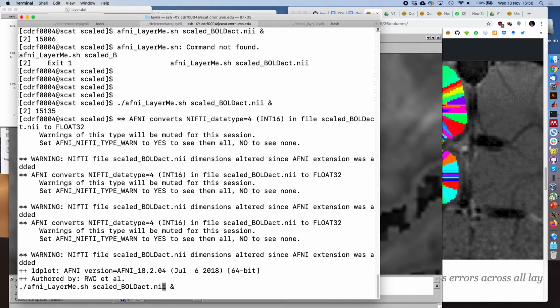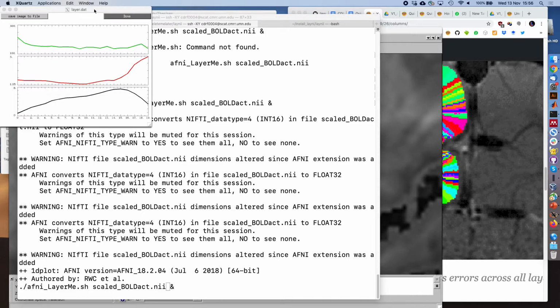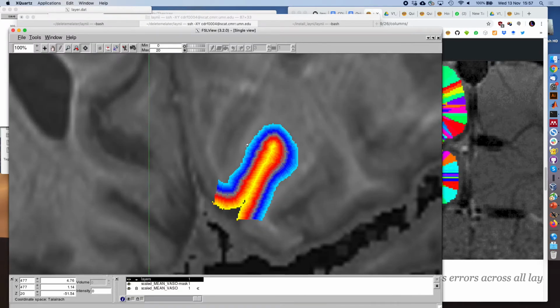What's the green line? Sorry, the green line. The green line is the number of voxels per layer. So it tells us if we are rank deficient. What John, you were not here yesterday. Like if this goes up and down, you probably have too many layers and you have holes within your layers. Here we again see that we have more voxels per layer in the deeper layers, and this is again due to the fact that we are concave in a sulcus. Like back there we have just more blue voxels than red voxels based on the geometry.